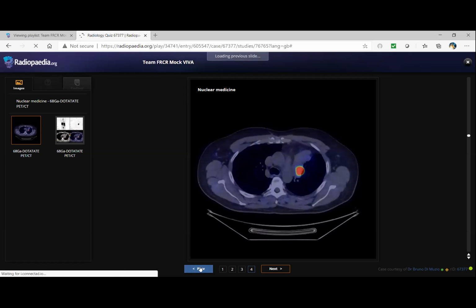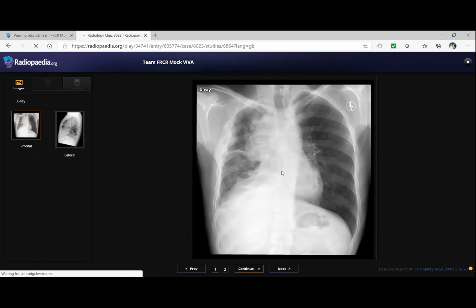So the other cases, I think you did excellent. This was a case of invasive thymoma, as you mentioned, and it was a mimic for mesothelioma. So your main differential over here would be mesothelioma versus an invasive thymoma. Of course, it was diagnosed on the CT later.